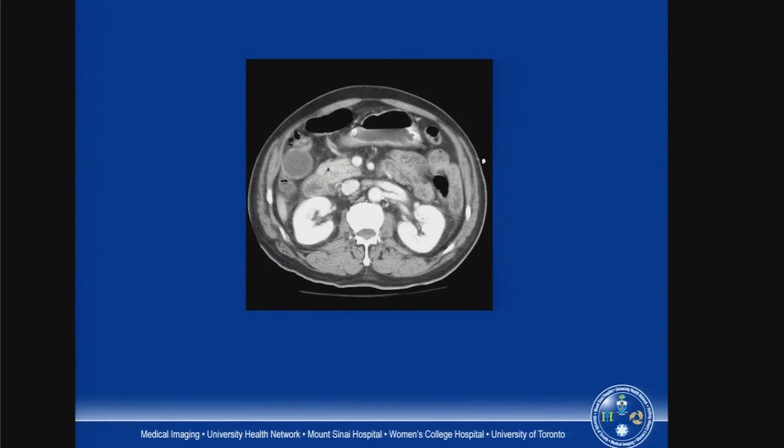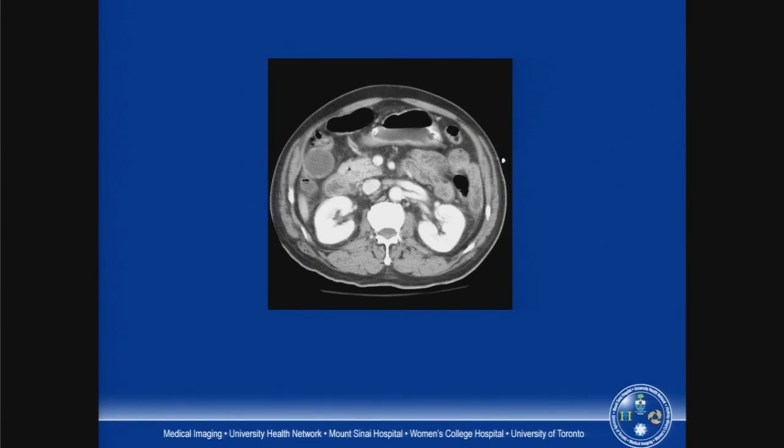If it's after hours and there's difficulty accessing MRCP, and you see biliary dilation on ultrasound, the patient's presentation suggests that there might be a stone, but you can't demonstrate it, then CT can be very useful, at least in our practice, where we have somewhat limited MR access out of hours. And here we see at the point of biliary obstruction, high attenuation within the bile duct.